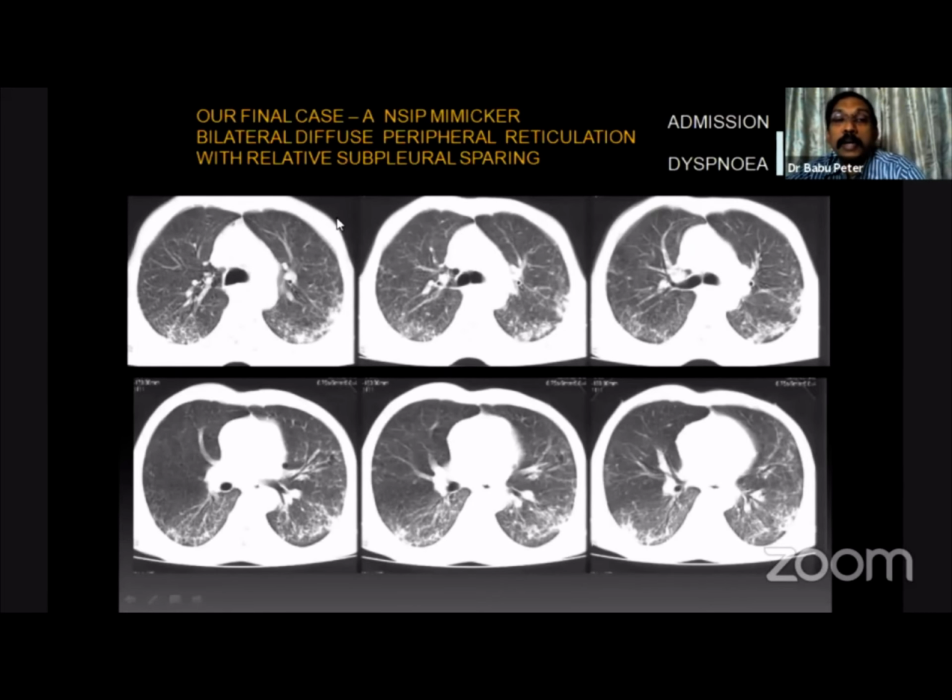So we have seen some common patterns. There are four main patterns. The first we saw was the nodular pattern. Nodular pattern can be either random, centrilobular, or perilymphatic. We saw reticulation, which can be due to interlobular septal thickening, which may be smooth, irregular, or nodular. The intralobular septal thickening can be differentiated based on the distribution and associated abnormalities. We saw ground glass, which is commonly diffuse, but can also be focal. And finally, we saw the mosaic attenuation pattern and the other pattern, which is the cystic air spaces. I shall now show some cases.